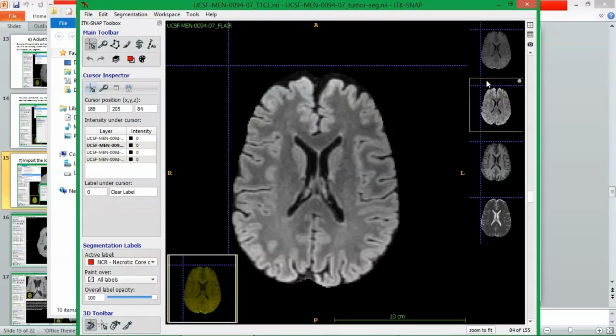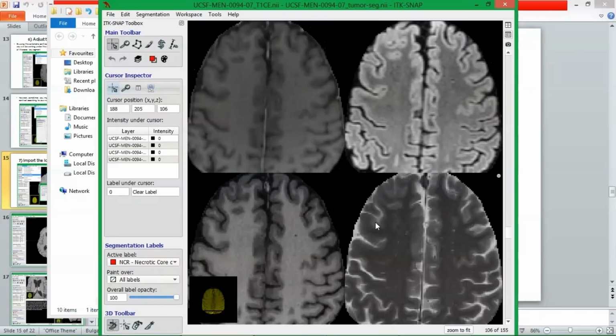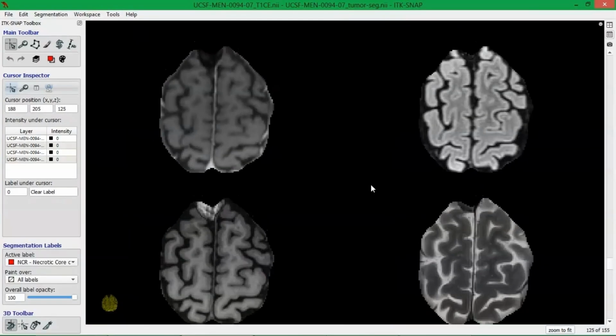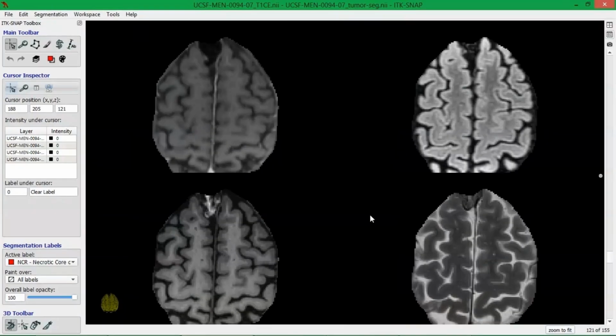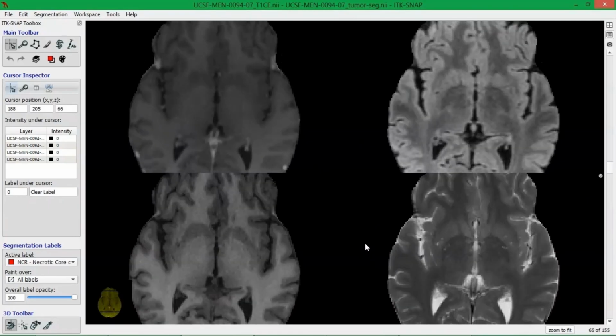And the last thing I want to show you is, by clicking here, you can, as I said, see all the sequences together.